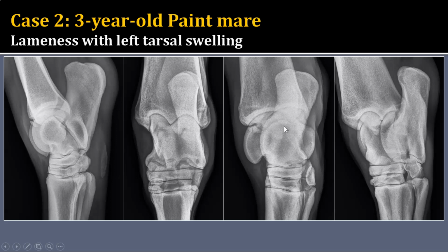So in this patient, with these findings of the intermediate ridge, the associated osteochondral fragments, and the joint swelling, there really is only one diagnosis, and that is osteochondrosis dissecans. And in this patient, it's dissecans because there are the fragments. Now, I am not going to get really concerned about you being able to pick out on a test, does this patient have osteochondrosis or does it have osteochondrosis dissecans? I think we should look for those fragments, but really it's all the process of osteochondrosis.